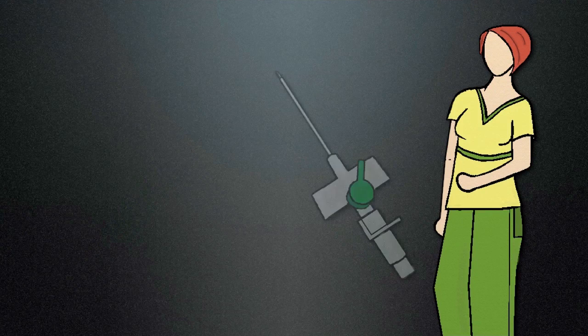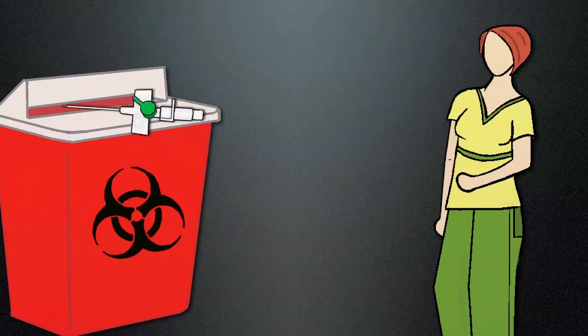If you use a cannula without a built-in safety system, you need to practice needle safety in order to avoid poking yourself or others. You should always try to discard of the needle in a sharps container as soon as possible.